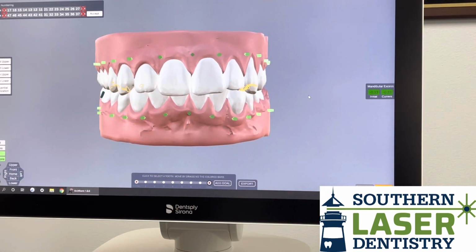On the bottom of the screen, you'll see that there are 8 stages. That's what those dots are. And that's telling me that the movement that I prescribed here will only take 8 aligner trays to complete. So that's it for this step. Next would be to send these 8 stages of models to the 3D printer for printing.